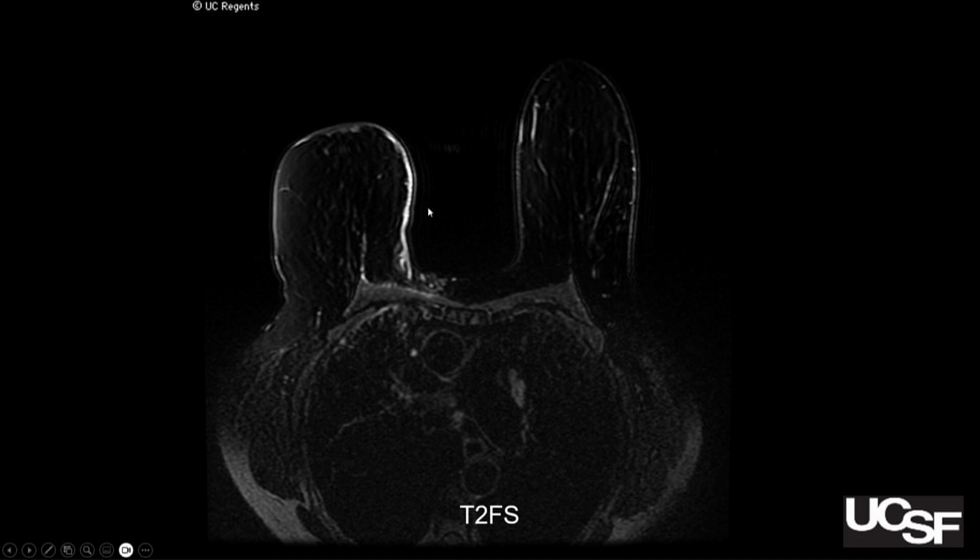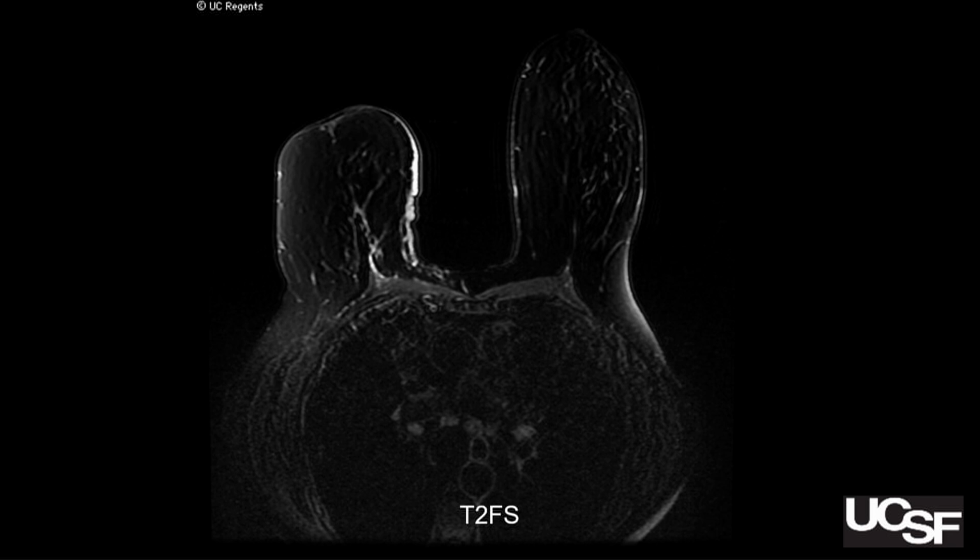And then remember, there was some skin thickening. And if you scrolled through the stack, you'll see there's also thickening. So if it looks perfectly thin, yes, you probably just ignore that. But if it looks like there is indeed skin thickening, and you can see this on an MR, then be a little bit wary. So here's another image through that. This is still the T2, but you can see the skin is thicker on the medial side compared to the lateral side. Like you could measure that.